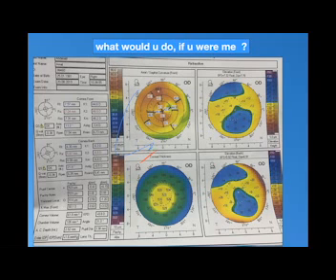If you stop at the Pentacam, the sagittal curvature or the topography is not well. So you will explore this patient and not do any refractive surgery because of these figures, according to the risk factors of this Pentacam. Yes, which is signed. Look at the black ovals and the circles.